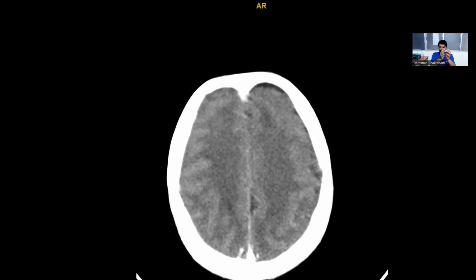When the cerebral hemisphere swells up, it will start pushing to the other side of the brain, which is normal. When that pushing happens, the third ventricle, which was there in between, will get pushed slightly to the other side. If the edema is happening in a little more superior part of the parietal or posterior frontal lobe, then you will be able to see the falx also bend.